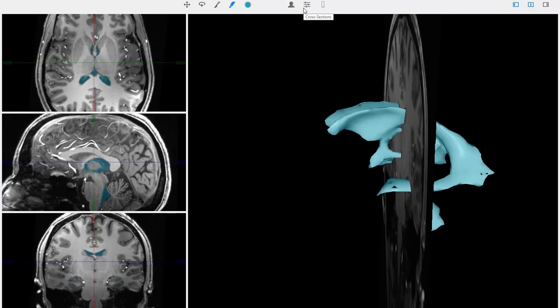The next structure I want to point out are the structures of the basal ganglia. Again, I'm going to use the ventricular system as a skeleton on which to build these structures. And the basal ganglia is an important system for proper initiation and proper selection of movement. So with disorders of the basal ganglia, there's not paralysis, there's just dysfunction in either the initiation or the inhibition of movement. The three major structures of the basal ganglia include the caudate, the putamen, and the globus pallidus. And let's point those out now.